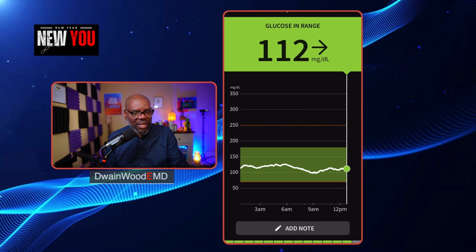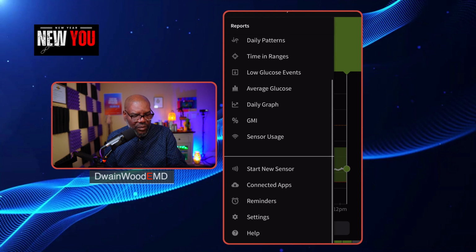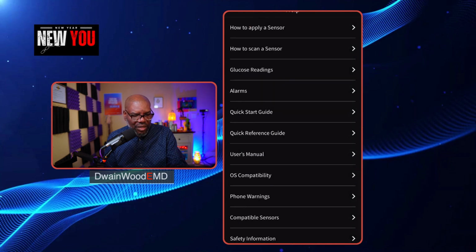And those are rapid. If it's going up on an angle to the right, then that means it's rising, but not quickly. Same thing going to the right and down. I don't have a picture of one of those, but I think there is in the help section. There you go.